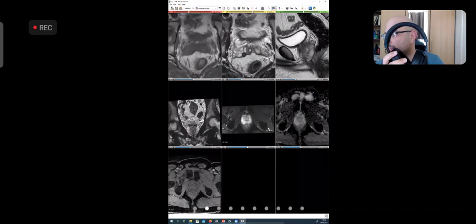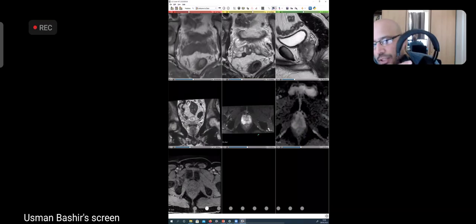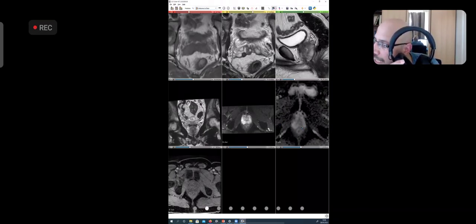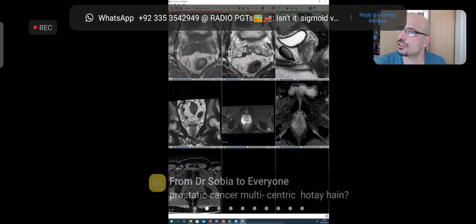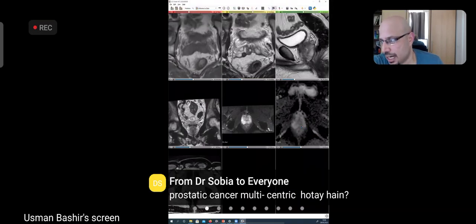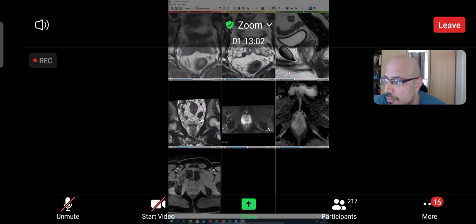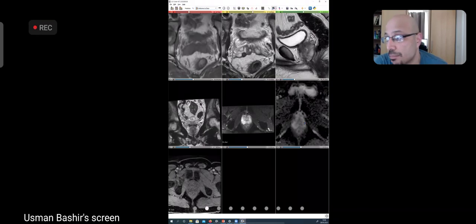Okay. That's it. And then secondly, this lesion is right at the apex of the gland on the left side, so I'll draw a dot on the picture I showed you. At the same time, I'll make note that I can see a bit of prostate gland outside those lesions, so these are confined within the organ. I'm not worried about this lesion. I don't care if this lesion shows up on DCE or not, because this is PI-RADS 4. Sometimes I even still call it PI-RADS 4 if it does not enhance on dynamic post contrast imaging.